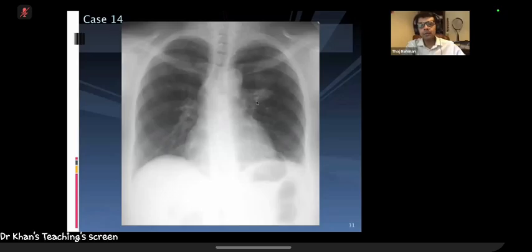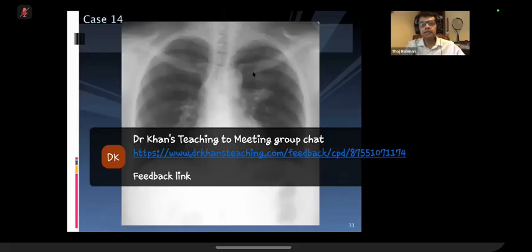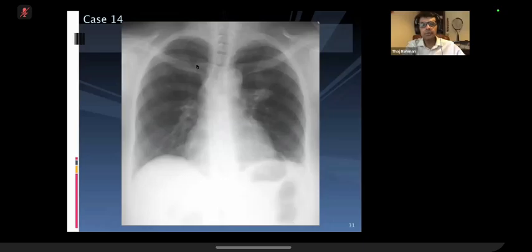Can you compare the blood vessels in the upper lungs on both sides and make a comment? I would expect, if there is a lesion which is causing obstruction of any sort or consolidative changes, there will be... No, just comment on the intrapulmonary blood vascular structures in the left upper lung and right upper lung. Just compare the vessels here and vessels here. I think they're a bit more prominent on the left. You mean the vessels are prominent on the left or sparse on the left?